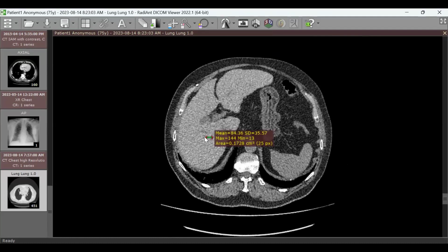Good. May have an arrhythmia. Yes, this is mostly an arrhythmic patient. Yes, this is a hyperdense liver. Maybe on antiarrhythmic treatment. This is mostly in cardiac disease, having amiodarone-related hyperdense liver disease.